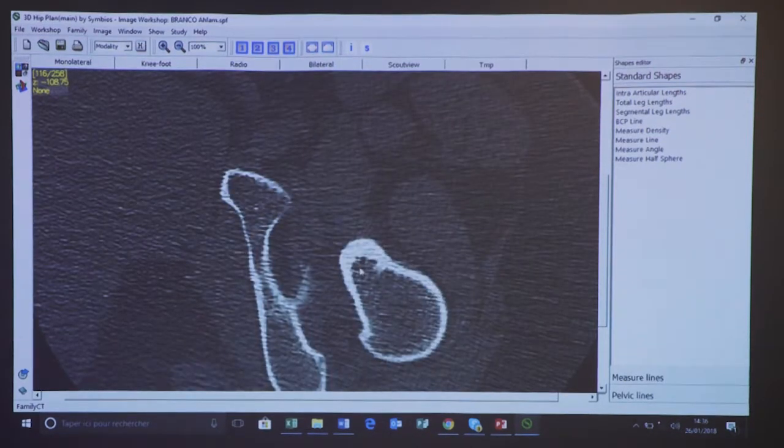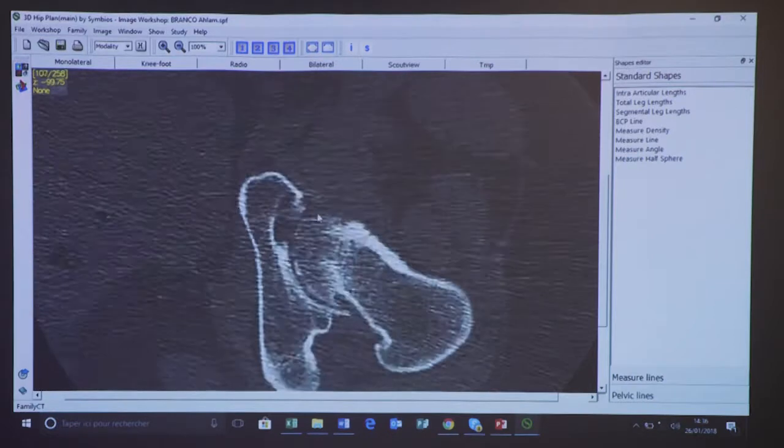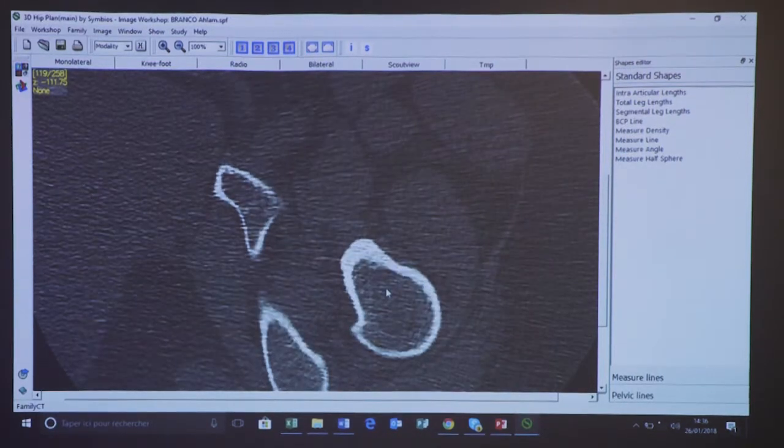If you follow the head torsion, the head will be somewhere here, and for sure it will dislocate. It's nearly sure it will dislocate, or at least we will have huge edge loading and sub-dislocation all the time. Regarding the bone density, I think it was correct. 141, of course. 140, she's a young lady.